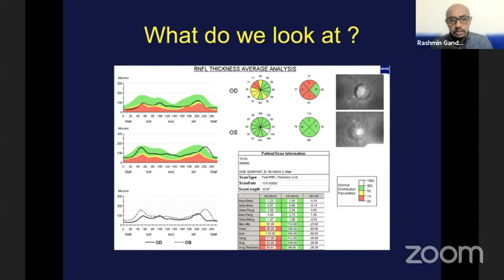In neuro-ophthalmic disorders, especially optic nerve disorders, in an acute phase, an acute insult, most of the conditions will lead to some degree of optic nerve head edema, which will be reflected in increased thickness of RNFL on OCT. And if the disease process is unabated or not treated, it leads to RNFL loss, and that will be reflected as average RNFL thinning on OCT.